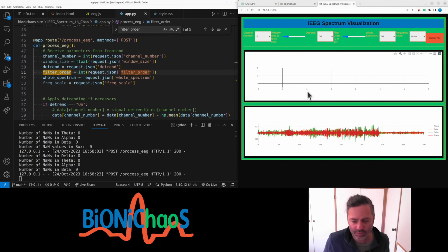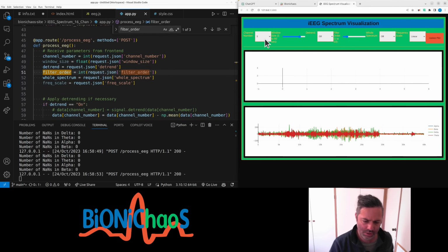Okay, we need to limit the filter order. Window size doesn't change anything. Why? Okay, channel number. Okay, this seemed to work.